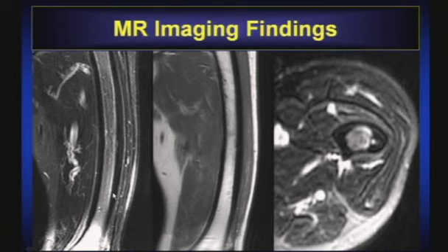When you protocol that MRI, be sure you run that femur, because we know that these lesions can happen so far distal to the lesser trochanter. We don't want to miss it, right, and have these fractures go on to complete. So what I find really interesting about some of the MRs I've been seeing, endosteal change. Look at the high signal intensity here. Here's the region of the abnormal osteoid starting to develop on the T1.